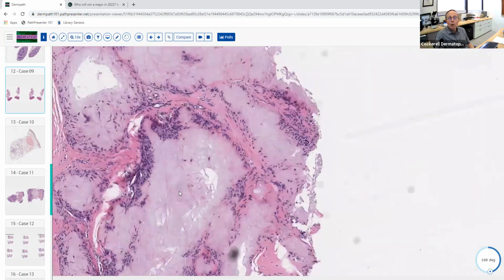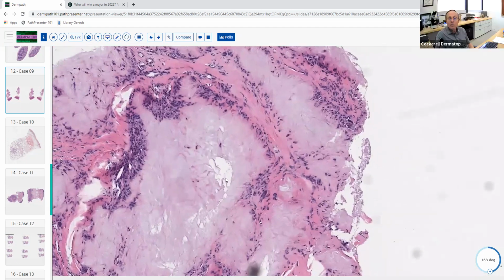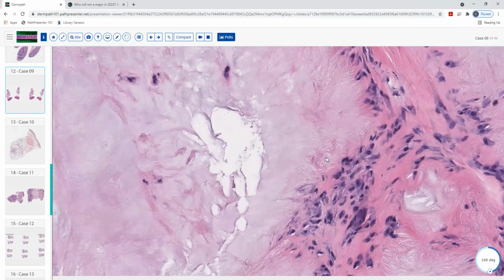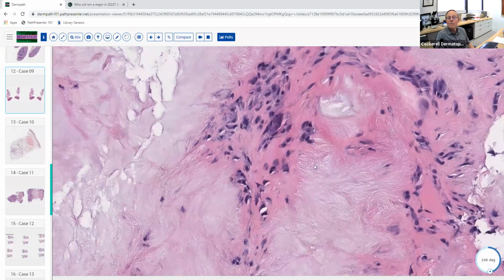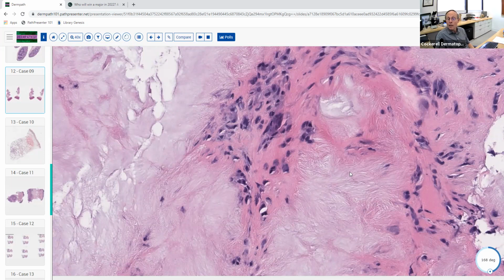So good. So you got a granulomatous inflammatory infiltrate, and you notice this material in here. And so how do you describe this material? So looking at it closely, you can kind of see these wispy lines in the material. Good. And so it made me think that maybe before there had been something linearly shaped in those areas, like needles, needle-shaped things. Yes, they are needle shaped. So when you see something like that, it tells you that it probably was a crystal.